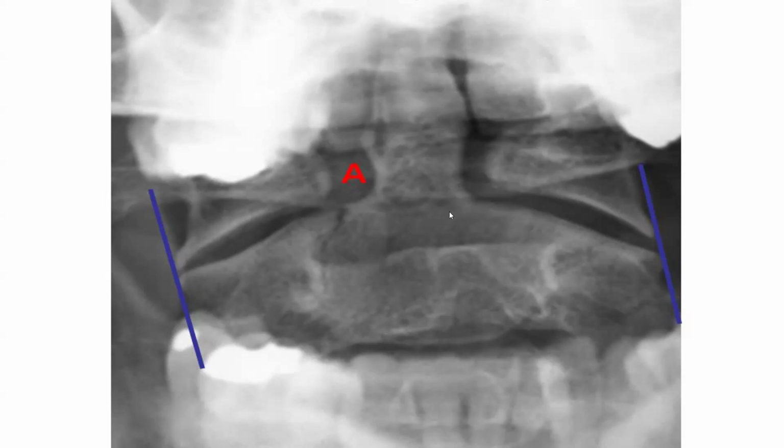the fracture here is obvious, in the base also. And here also, if you check this part, there is disruption here. Okay? And here disruption also. So this one is in C2, in the dens and in the vertebral body itself. Okay? Yes, sir.